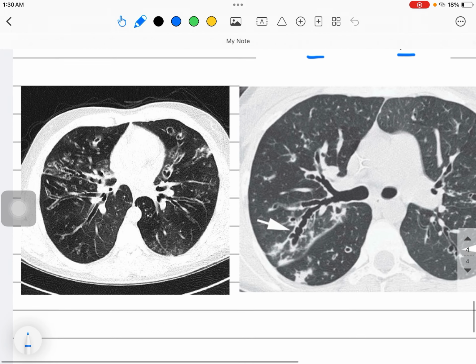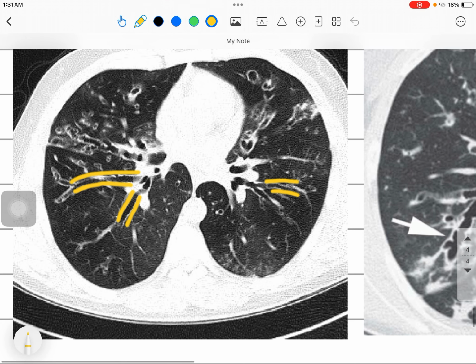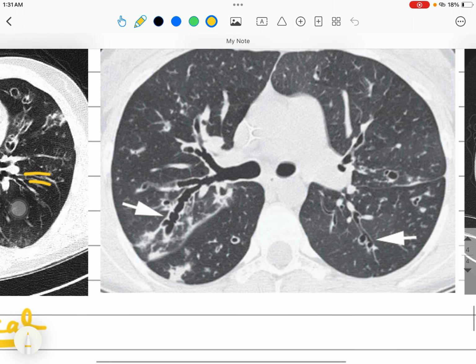If we talk about it radiologically, here in this CT we can easily find out that the bronchus are actually dilated. There is the abnormal dilatation of the airways or the bronchus, and they have a uniform caliber, right? They are in a straight line like this. You can see this pattern bilaterally, isn't it? So this is which kind? This is the cylindrical bronchiectasis, right? That's how we identify cylindrical bronchiectasis in the HRCT thorax.